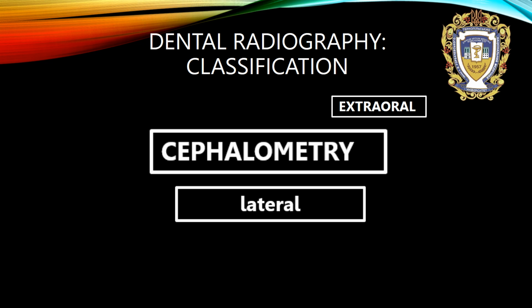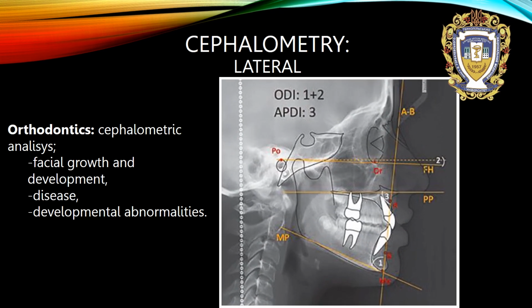Lateral cephalometry. Orthodontics aims cephalometric analysis, facial growth and development, disease and developmental abnormalities. Orthodontists use evaluation of lateral and frontal cephalometric X-rays to make diagnosis, to plan treatment, to control duration and final results of treatment.